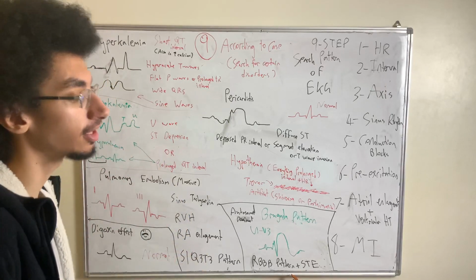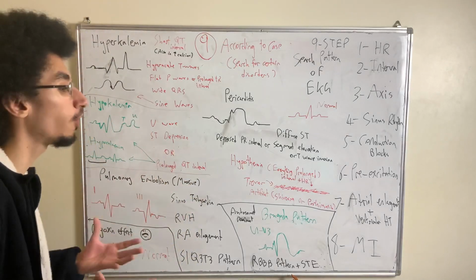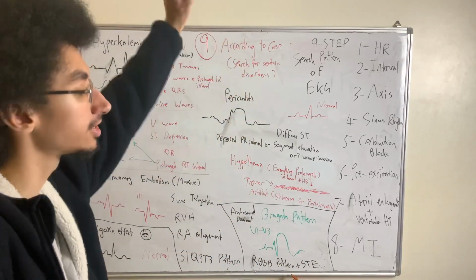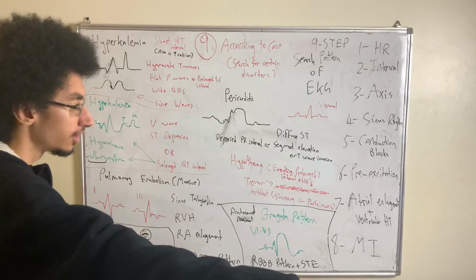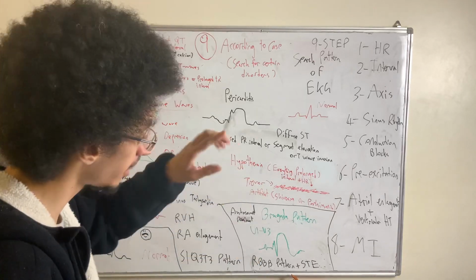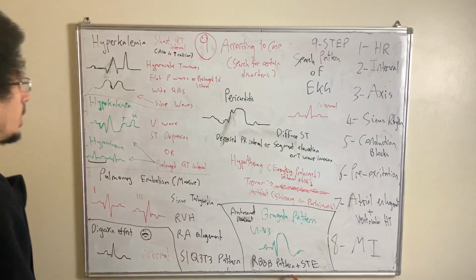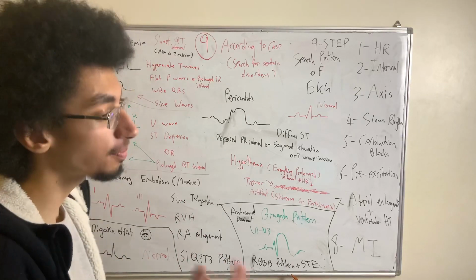Even ST segment elevation, although this one is the most specific for STEMI, which is why it's important to always know that at the end of the day, EKG is a tool. It is there to what? It is there to confirm your diagnosis, not make your diagnosis. You must have your history done, you must have your examination done, and then following your investigation, you will confirm the diagnosis. So a hyperacute T wave, that can be STEMI, and that can be hyperkalemia.